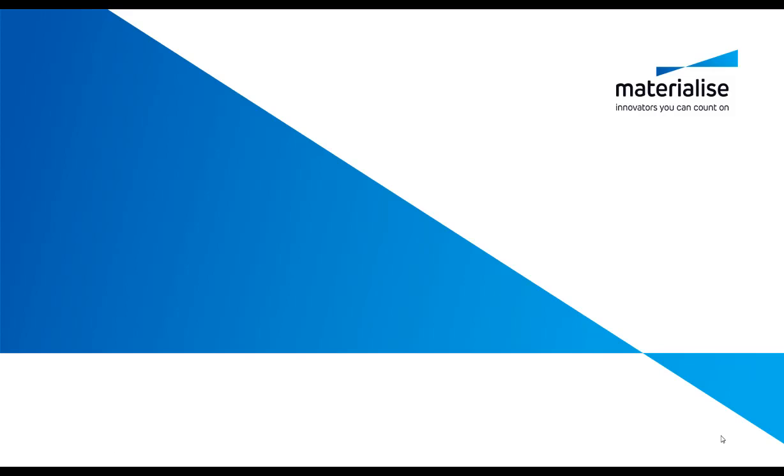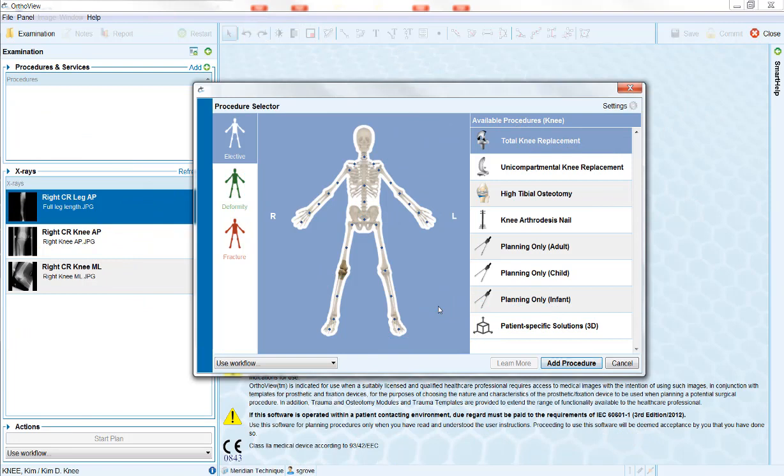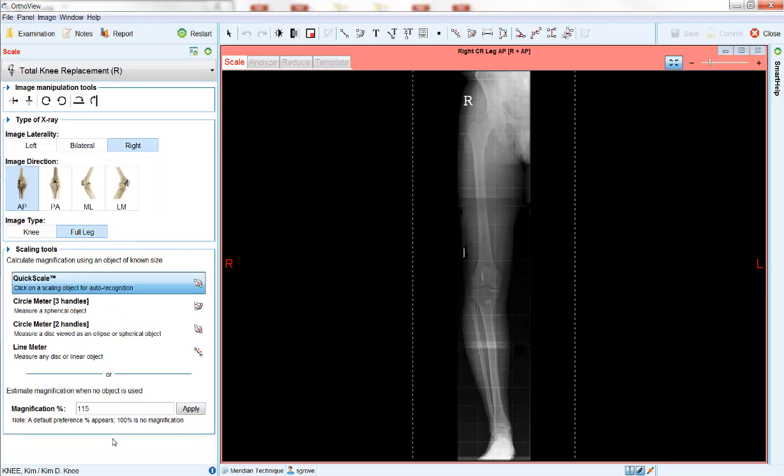Welcome to this short Materialise Orthoview training video on planning a total knee arthroplasty with a full leg AP image. First, open the study and select the required procedure in the procedure selector. In this case, a total knee arthroplasty on the patient's right knee. Choose the appropriate images from the panel on the left and select Start Plan.